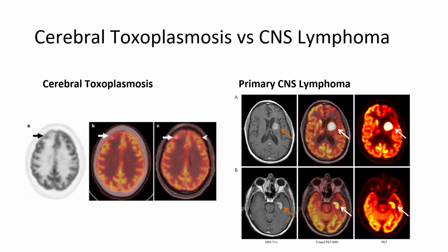If it has a lower SUV value and it doesn't have a lot of excess hypermetabolism, just maybe a little bit, then it's more likely to be an infection or inflammatory process. But if it is oncologic, if it's cancer, then it's more likely to be super hypermetabolized and take up a ton of sugar and show up really, really bright on our scans.